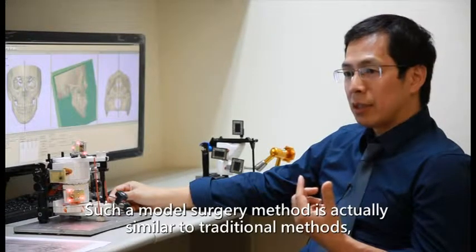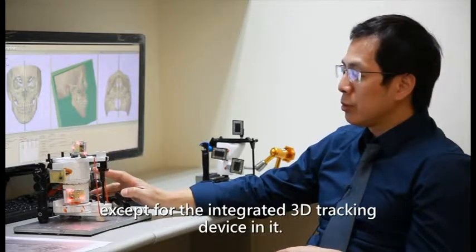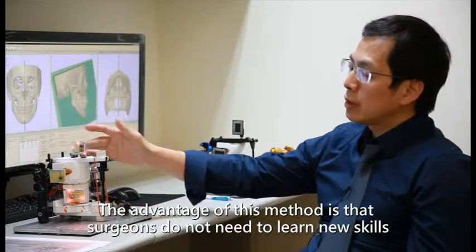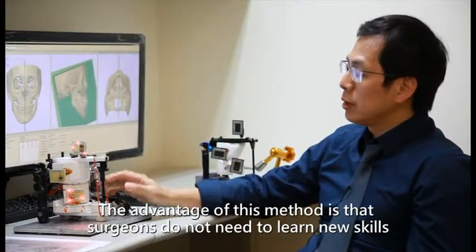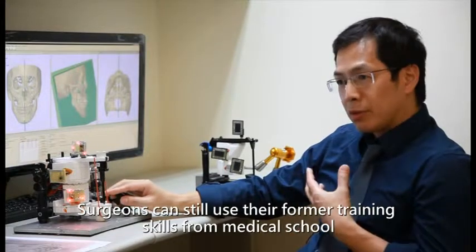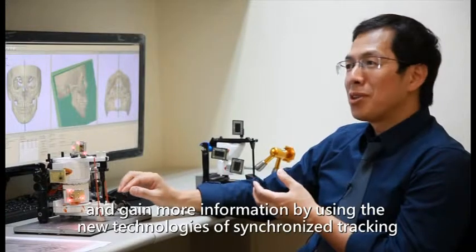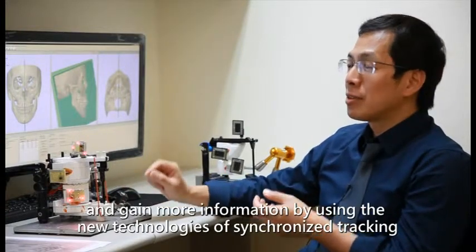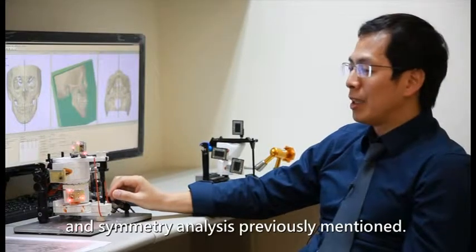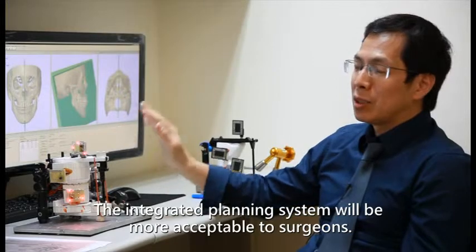Such a model surgery method is actually similar to traditional methods, except for the integrated 3D tracking device in it. The advantage of this method is that surgeons do not need to learn new skills, such as computer drawing or animation. Surgeons can still use their former training skills from medical school and gain more information by using the new technologies of synchronized tracking and symmetry analysis previously mentioned. The integrated planning system will be more acceptable to surgeons.